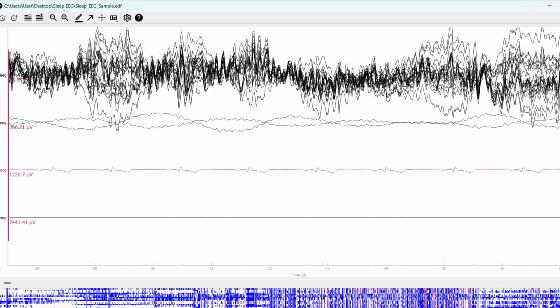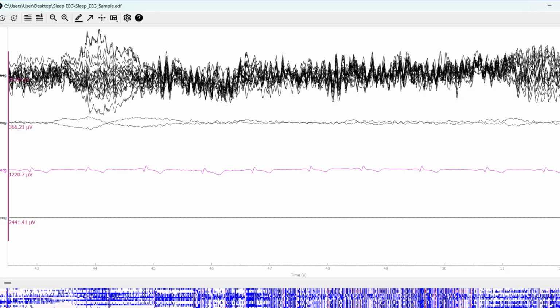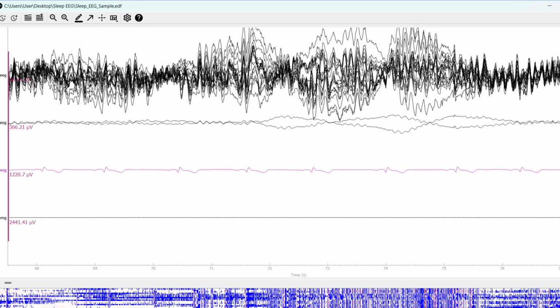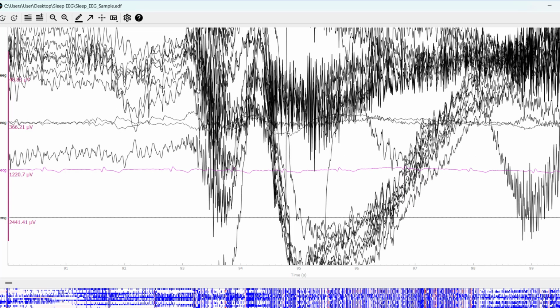It's also great for seeing global brain rhythms. If a participant, for example, has strong alpha activity at 10 Hertz, all the channels will show the same gentle oscillation, and the butterfly plot lets you see that pattern at a glance. So even though it looks like a swarm of colorful or black lines, this mode gives you a way to detect outliers, check data quality, and understand the global structure of the EEG.